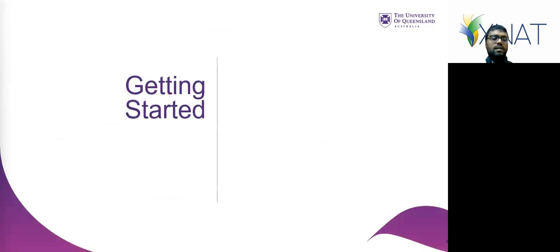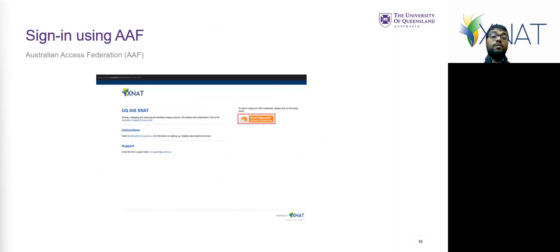So this is a small introduction on how to get started on the XNAT, especially for HIF users. Signing in is via AAF. This is enforced across the board. AAF is a federated authentication service used by Australian universities and various research organizations.